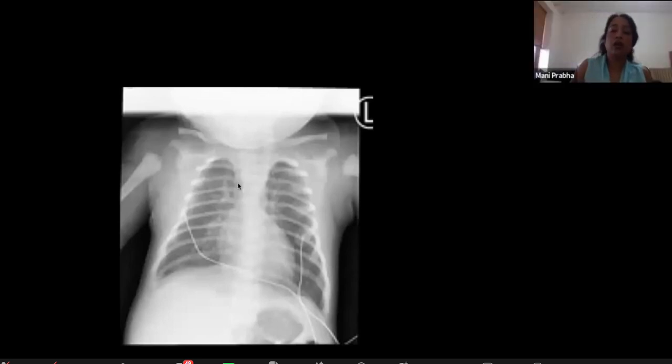And see the narrow pedicle here. I know it's very difficult to come to a conclusion, but the way to describe it and reach the differential diagnosis is what we want, and the rest we leave to echocardiogram. The cardiac size is not enlarged, and there is pulmonary plethora, and you are absolutely fine to ask if it is a cyanotic or acyanotic condition. With this narrow pedicle here, it is TGA. But you may not reach the conclusion, that's absolutely fine.